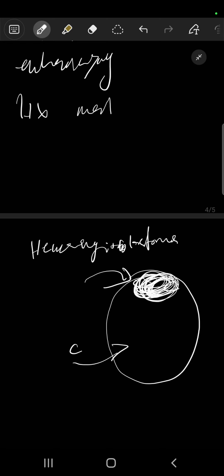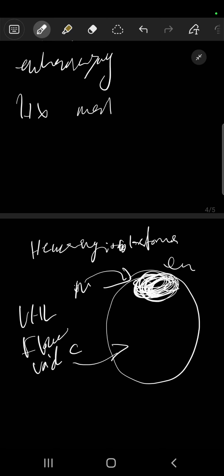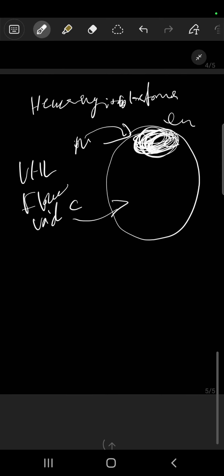This is the cystic part. This is the nodule. And note that it is mural on the wall, and it enhances with contrast. So T1 contrast enhanced MRI, it will enhance this mural nodule. Think about von Hippel-Lindau in those patients. Look for the flow voids that will help you differentiate it from the pilocytic astrocytoma. But this is the cystic mass with enhancing mural nodule in adults.